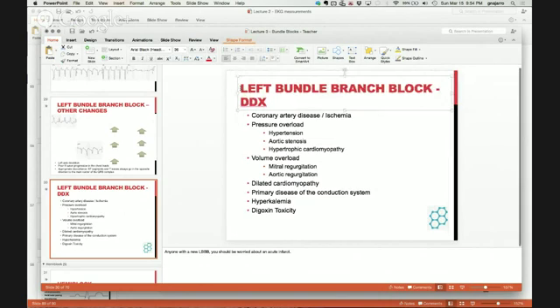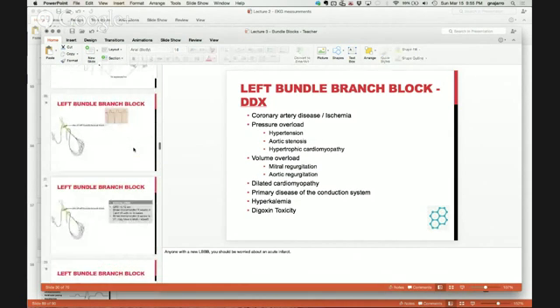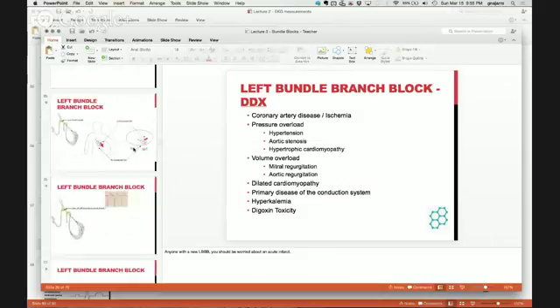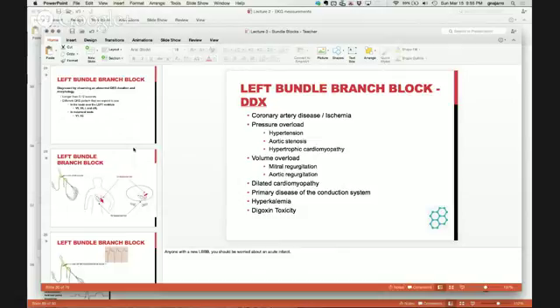Does that make sense? Yeah. I just didn't know if we'd have to pick out, like, oh, it's a volume overload, aortic regurgitation, something like that. If you see a left bundle and I tell you that this patient has some characteristic clinical exam findings, then yeah, you should be able to put 2 and 2 together. Okay, that's what I was wondering. My goal is to have you read the technical details of an EKG and understand what's happening, understand where electrical forces are going.